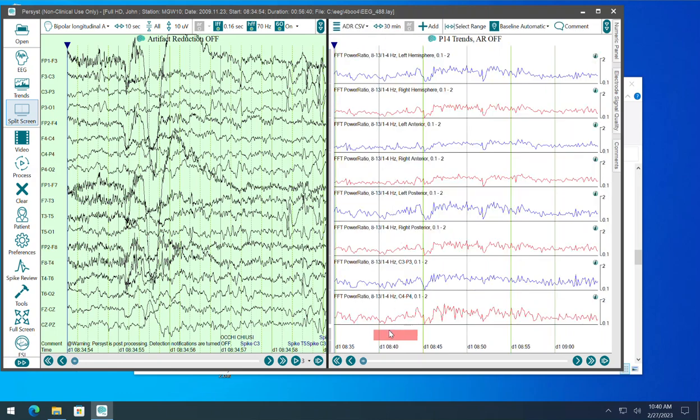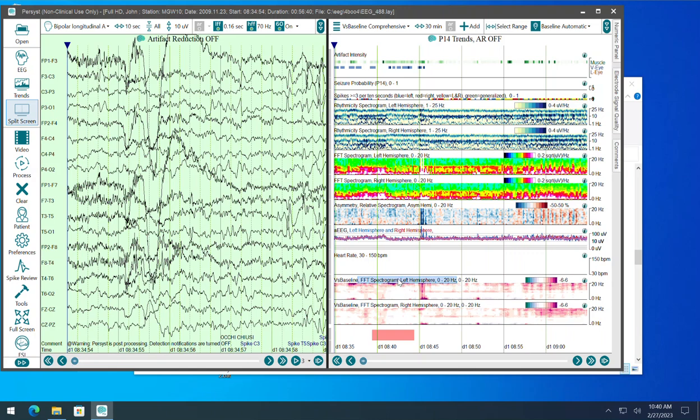And speaking of versus baseline, you can set a baseline in a recording, and you can export trends that have the normalized z-scores from that using an empirical null. This is a n value, so it's versus baseline n value, which is the third dimension there. It's a 3D trend where you've got x, y, and z axes. Increasingly red is higher z-scores, increasingly green is lower z-scores. And the idea of this is that with an empirical null, you can use the patient as their own baseline and look at statistical changes there, which can work where you don't have an expectation of what the change will be, but you want to know if there is a change.